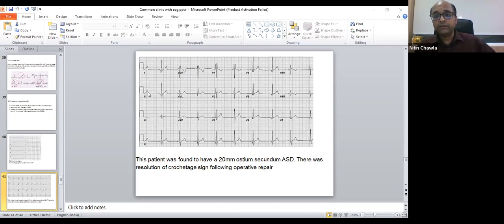Normal sinus rhythm calculation itself is very important. Madam, if you do not look at P wave morphology, you cannot comment upon normal sinus rhythm. If the P wave axis is high RA, then it is a normal sinus rhythm. Otherwise, you have abnormal sinus rhythm. By dictum, we jump on QRS, but taking consideration of P axis is equally important. I hope I was able to answer your question.